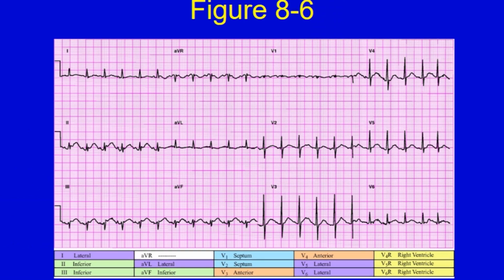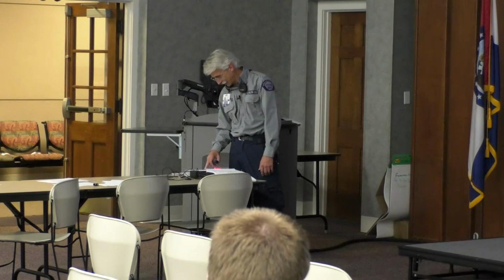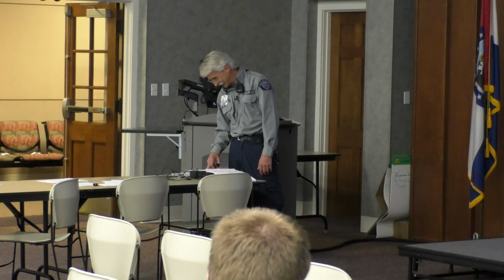Is there any depression? Not enough to talk about. There might be, they claim there is in AVL, but. Increase the gain so that I could see it. Yeah, well, see, and there you go. That works too.